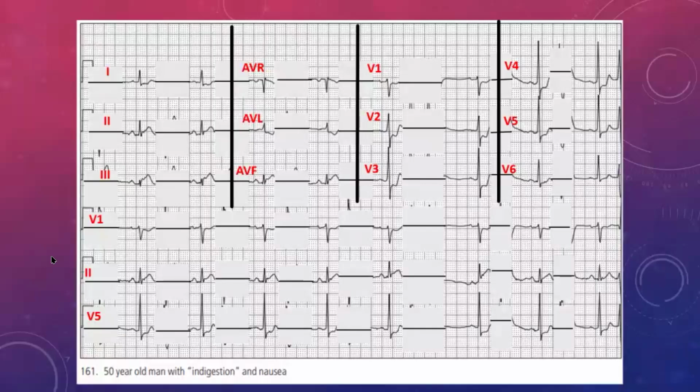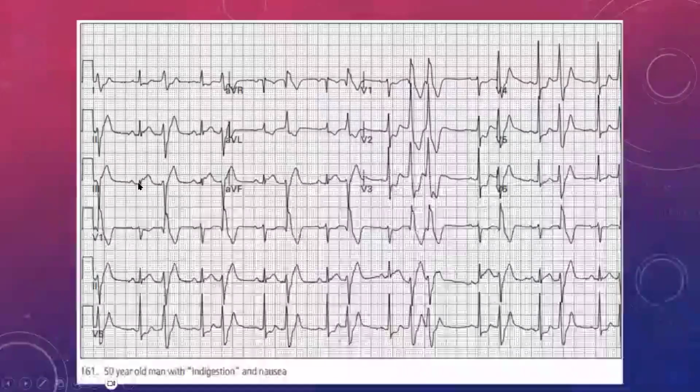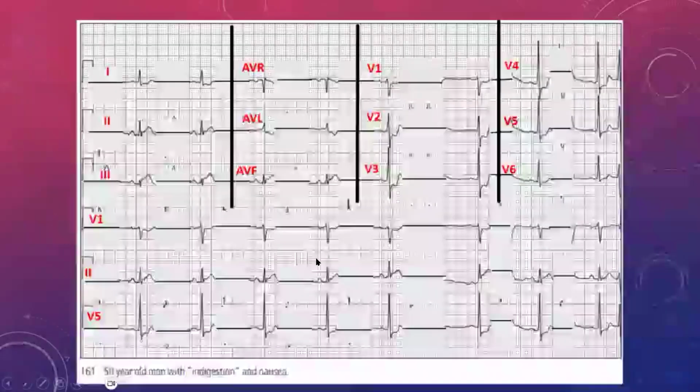Because if we look at the original ECG that we had, now all of a sudden you realize, okay, this is just an infarct. There are other things that are going on. But once we look at just the things that look normal, or the things that we understand, it suddenly becomes a lot clearer as to what the diagnosis may be. So it still looks scary when you look at it like this, and we're still going to look at the scary parts. I'm just saying, we remove the scary part.